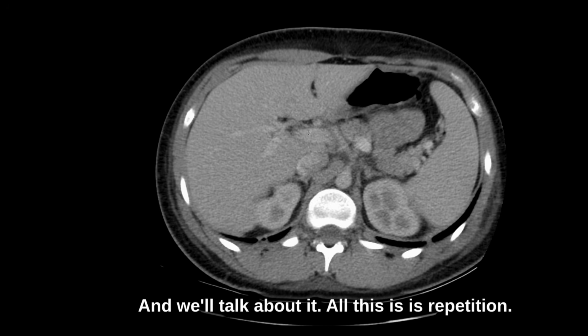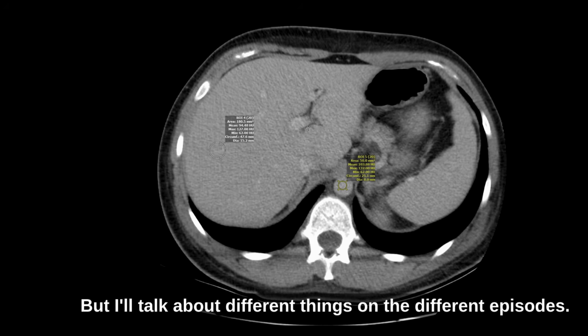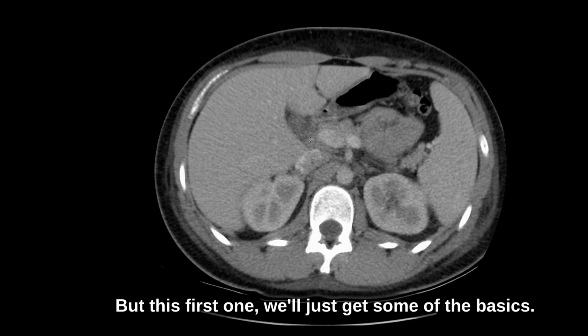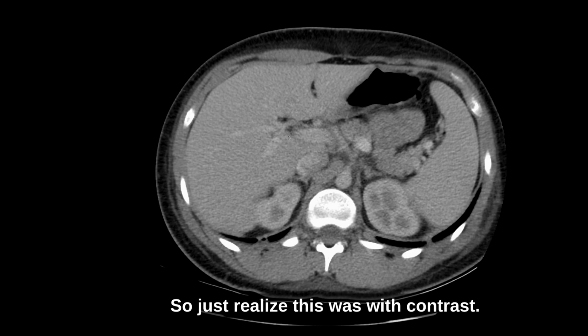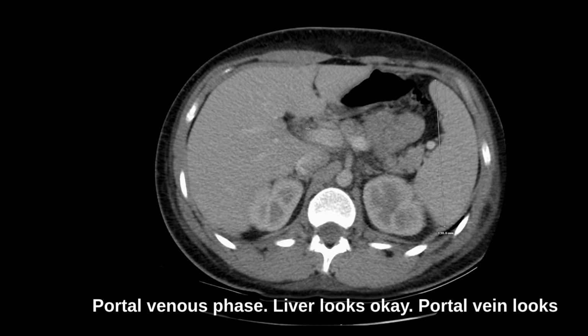And we'll talk about that. All this is repetition. We'll keep repeating this. Let me know if you like this format, but I'll talk about different things on the different episodes. This first one, we'll just get some of the basics. So just realize this was with contrast, portal venous phase, liver looks okay, portal vein looks great.